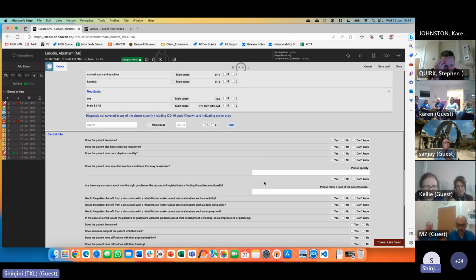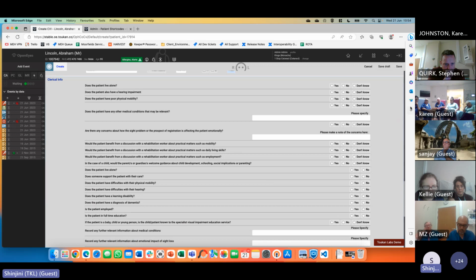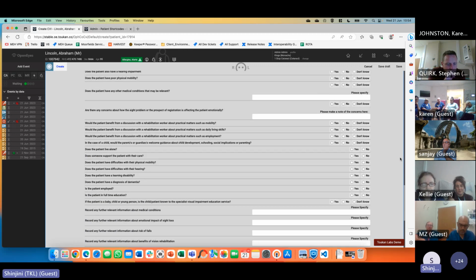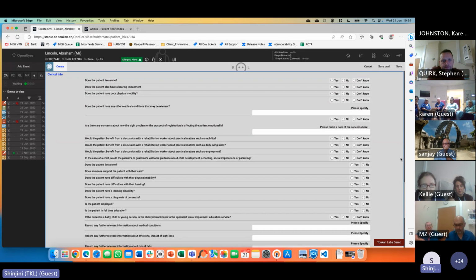And then comes the list of the questions that the clerical team generally fill. At this point, the doctor can do a save draft, and the admin staff can then send it to the ECLO team. I don't know if you have one in your organization, but in Moorfields, they have an ECLO team, and they generally do the signature capture of the patient and the clerical info.